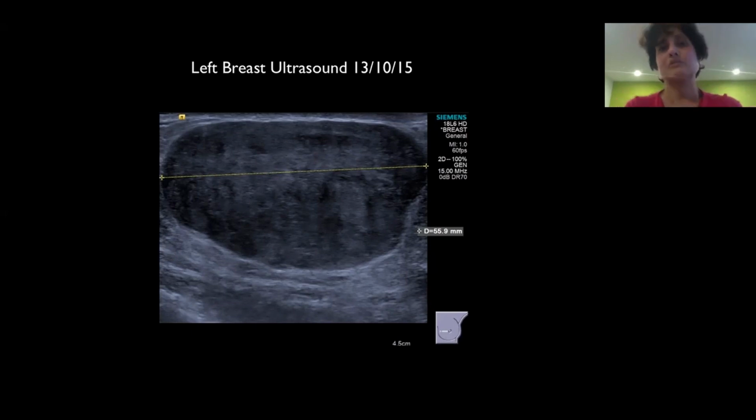At the outset, when you look at a lesion that looks benign, you could say that this is a fibroadenoma with a possible differential of phyllodes. It's not a diagnosis that you need to make on ultrasound. It is a biopsy diagnosis.